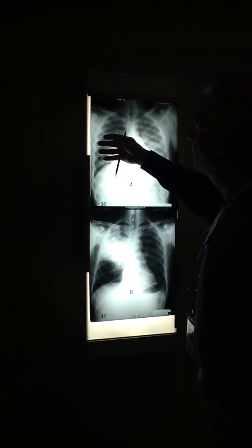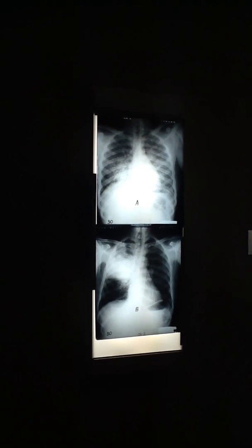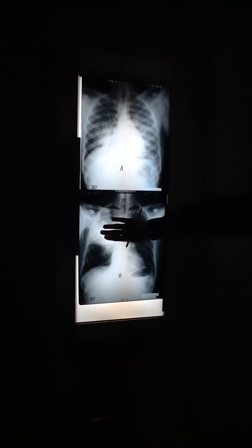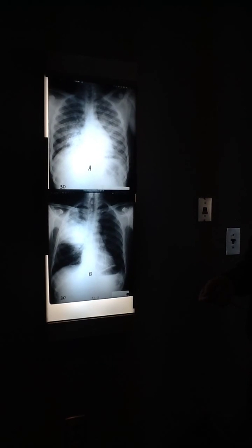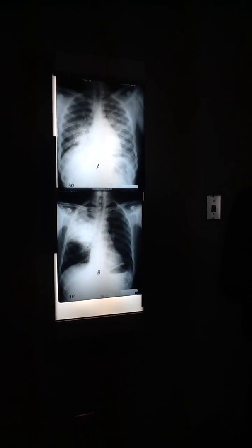And remember we talked about Big Orange and how those peripheral lymphatics are a little bit better able to keep the lung clear out there. All right? So this is water, plasma fluid. This is pus, exudate. Pus and water cause most airspace consolidation. Blood is next, and that's either from traumatic or non-traumatic bleeding. Okay?